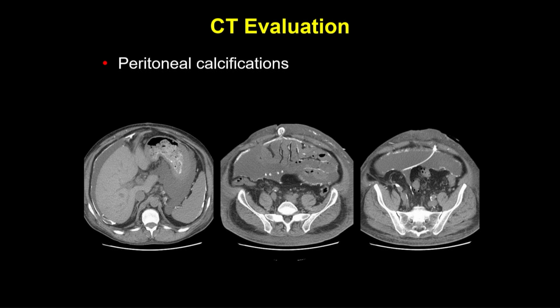Here's peritoneal calcification. So we're seeing it even going into the umbilical hernia. And the key to the diagnosis here is, of course, this peritoneal dialysis catheter. So these people get encapsulating peritoneal sclerosis, often with calcification. We'll talk about that a little bit later too.